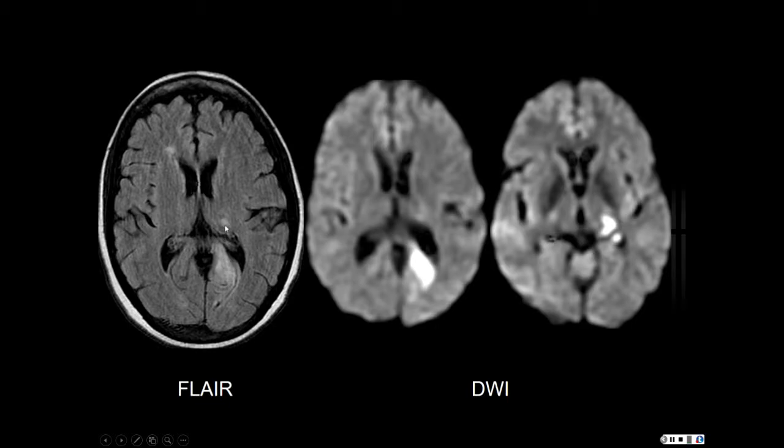although given the patient's presentation, we were thinking ischemia. So this is FLAIR. Again, it picks up microvascular ischemic changes all over the place. This is chronic. But this, not really sure of age. Got the diffusion-weighted imaging. Bam, left PCA, mass effect, and left thalamic. That's acute to early subacute ischemia.